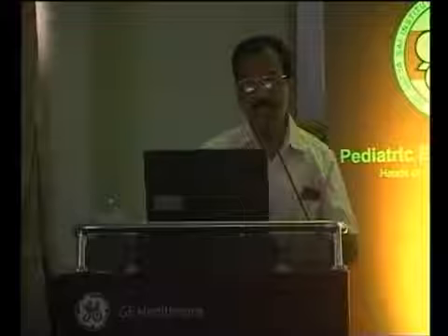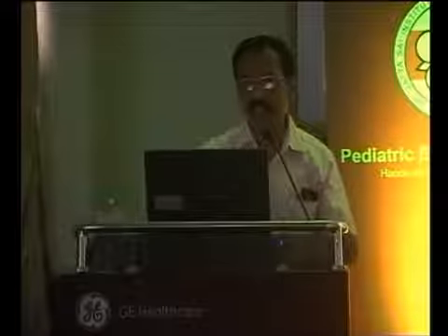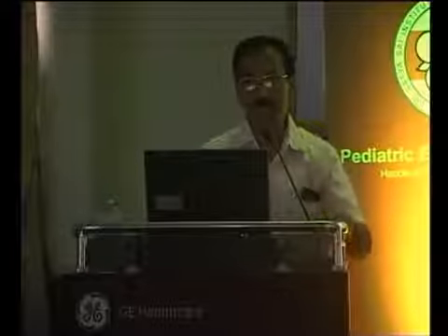It's a very good question, because this happens when you start your career, how you generate the pictures. But over and above, we try to standardize these views and show them properly. Especially if you are going from the parasternal region, you have a wide area to slide and generate some pictures. You may be generating off-axis pictures. But from the subcostal window, or with the standard planes, you are generating either a long axis or a short axis perpendicular section.